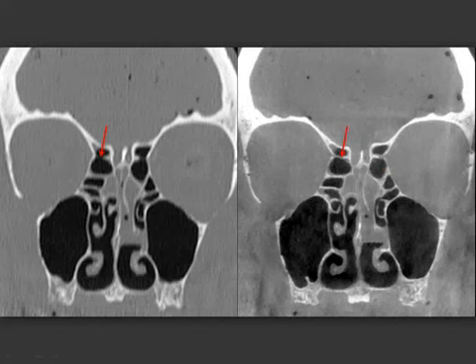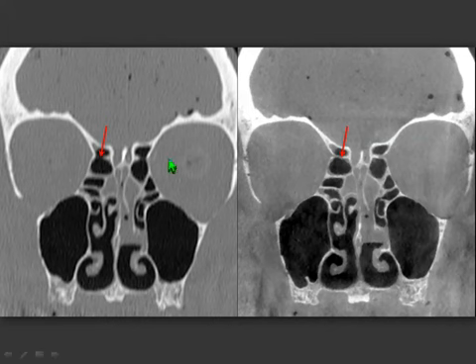But the advantage of the cone beam CT is mostly detectable when you are comparing, like in this situation, this is a specimen, the reconstruction in the coronal plane from CT with the reconstruction in the coronal plane with the cone beam CT, because the flat panel gives you the advantage of detecting very precisely the structures that run in the horizontal plane that are very difficult to reconstruct with the CT.